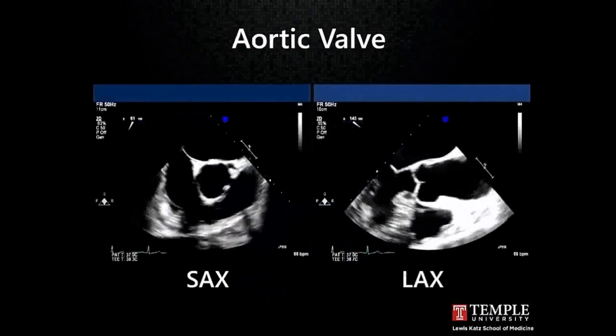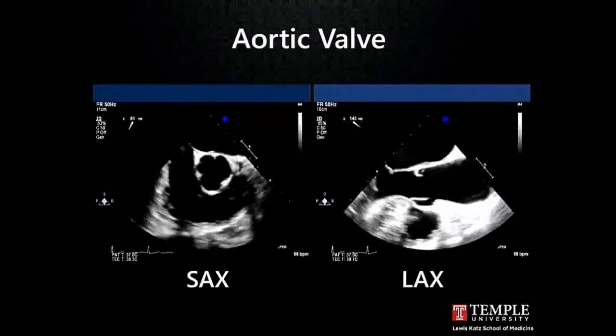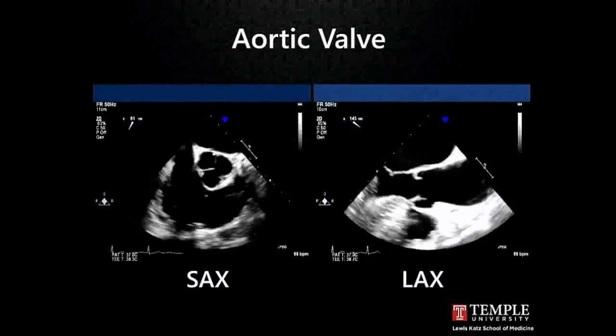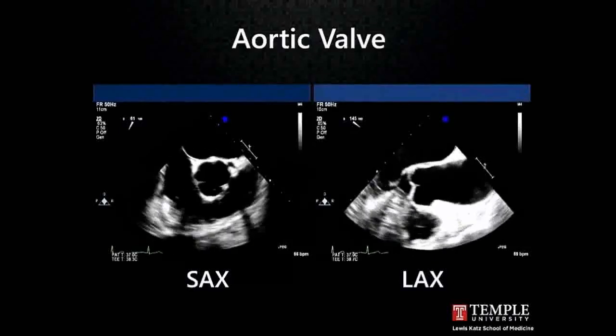How about the aortic valve? So these are some more standard images from our guidelines, looking at the aortic valve on a TEE. Now the left atrium is at the top of the sector, right? You can see the omniplane angle always reported. That's always the giveaway, unless they crop that out. The RV, which is the most anterior structure in the heart, is the furthest away. And then you can see the tricuspid and the pulmonic valves.